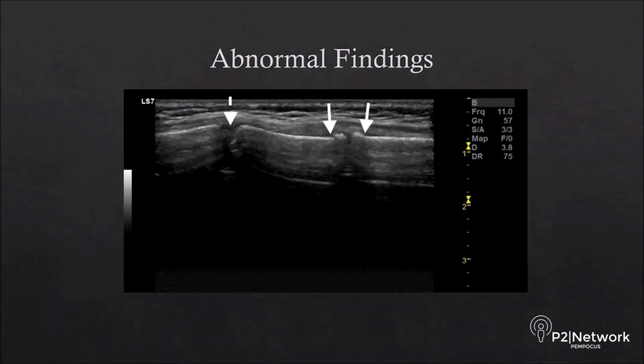Here is an image of the abnormal anatomy that you can see. The dotted arrow on the left has a normal growth plate where the edges are nice and round. On the right with the solid arrows you have the buckle fractures in the sternum as well as small areas of hematoma above it.